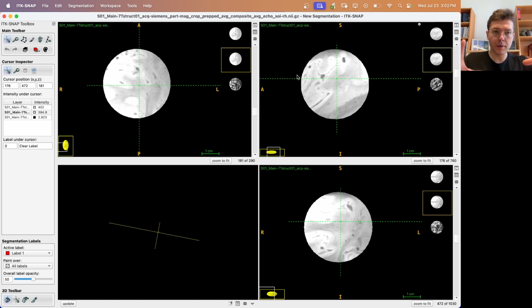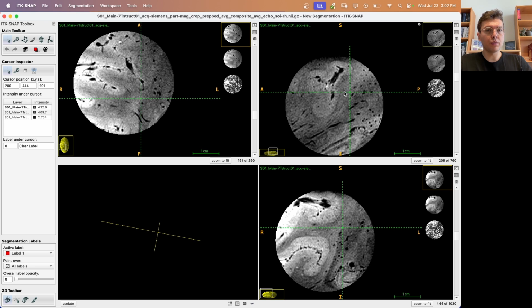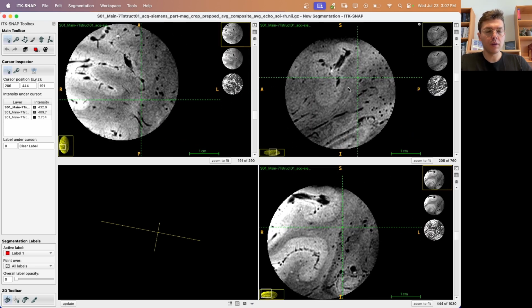This is good to just keep our focus in here at the initial stage of the segmentation. Okay, so once I loaded these three masked maps, here I'm really going to show you maybe the most brute force method of doing it. I take my drawing tablet, and I start just segmenting manually.